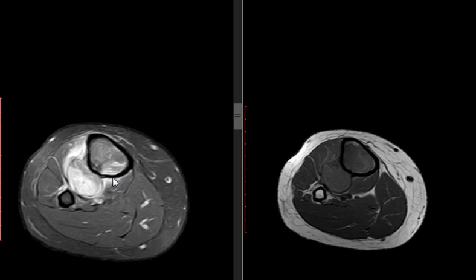The onion peel, where do we see it? On the X-ray. We must have an X-ray. We always tell you that when a bone MRI comes, the first thing you ask is where is the X-ray? I will tell you I don't have an X-ray, but you have to ask. You must ask. If you don't ask you lose marks. For any bone CT or MRI, before you say this is an MRI, ask what the X-ray is. I say I don't have one, okay, you get these points and you didn't lose points. The X-ray is very useful here.